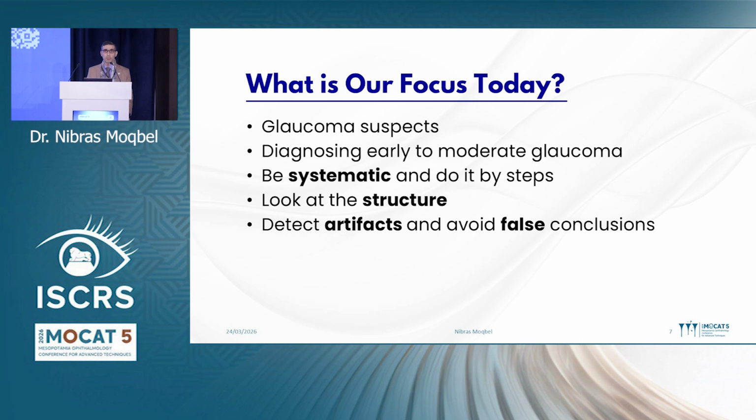Our focus today would be on glaucoma suspects. We're trying to detect early to moderate glaucoma cases. We're trying to learn how to be systematic and do it step by step. We try to look at the structure and detect artifacts which may lead to false conclusions. So how would we do that?